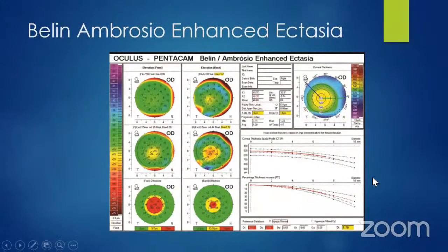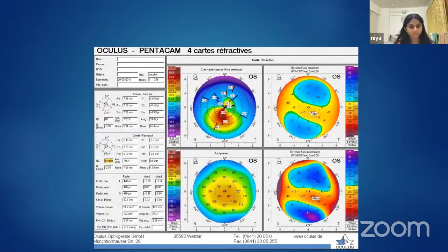And this overall D score, this final value is what you will get. So this is calculating front, back, pachymetry, displacement, everything, and showing you. Outrightly it was not ectatic, but when we do this, we are seeing some ectasia. So the overall D score is in yellow, which is putting this in a borderline situation. So this may not be outrightly keratoconus, but in this kind of a patient, if you go and do a Lasik, then you may be causing it to become a keratoconus. Okay? Okay. Thank you. Yeah, sure.